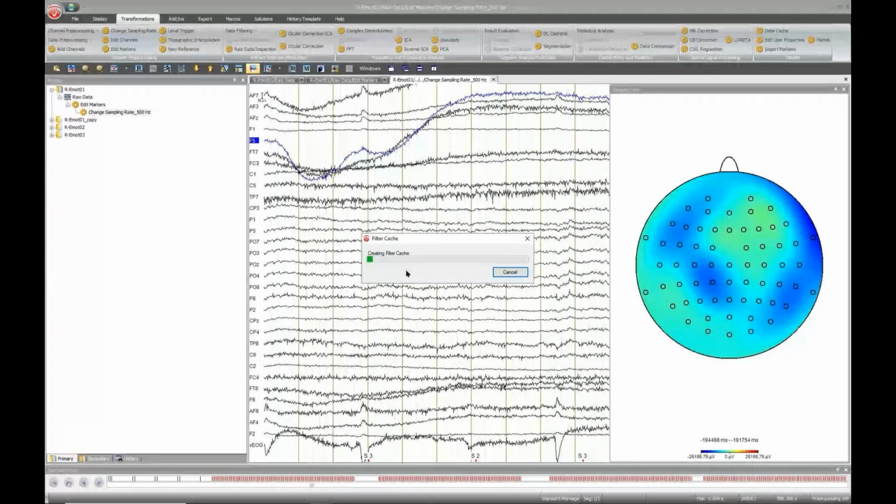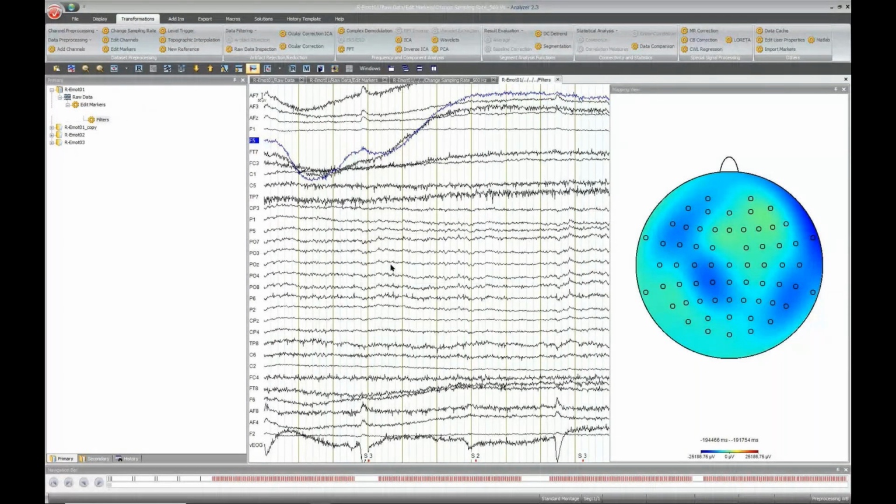which we see now is creating the filter cache, writing the outputs into the disk, for which right now we have to wait a little, especially since this data set is a little long. However, the advantage of waiting now is that we will not have to wait later, and the subsequent pre-processing will also be faster. So we're almost there. And yeah, now we have our filter outputs.